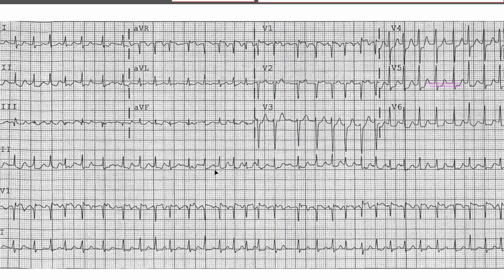Now I'm going to go back to, and I'm just going to box this up here so you really focus on that and you don't forget it. Okay, so you see something that's fast, it's irregular, you label it atrial fibrillation and you move on. No. Wait. See if there's anything else going on. Again, this rate needs to go down for you to see if this ST depression goes away.